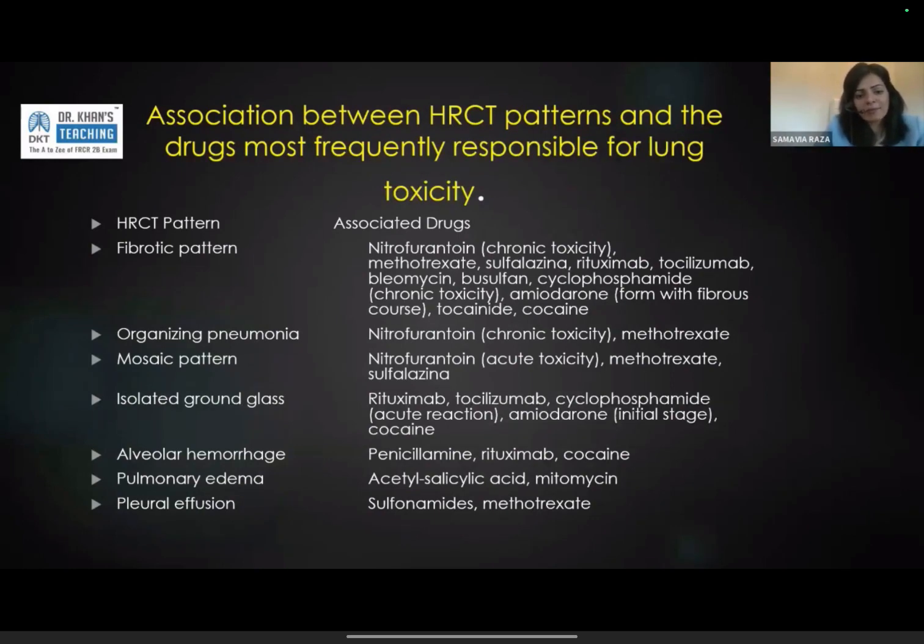So you can have an RA patient on methotrexate, and the question is, does the patient have methotrexate induced lung injury? And that's a really, really hard question. And the thing to look for then would be acute looking changes. And by acute looking changes, I mean diffuse ground glass, more consolidation, dirty looking abnormality that has come on within weeks or months even. So the last scan was 3 months ago and the scan looked very different. Now they have new ground glass and the patient was put on methotrexate. So the acute looking changes should make you think of drug induced rather than purely fibrosis.